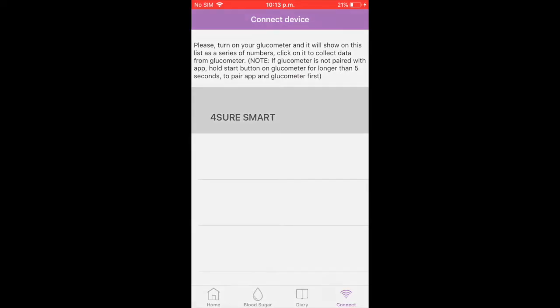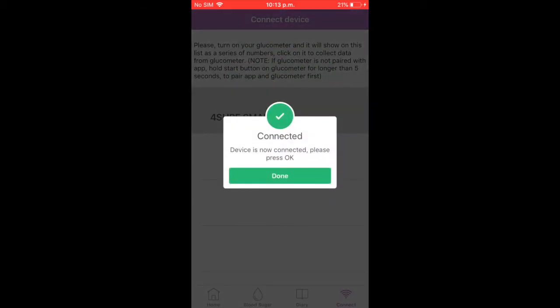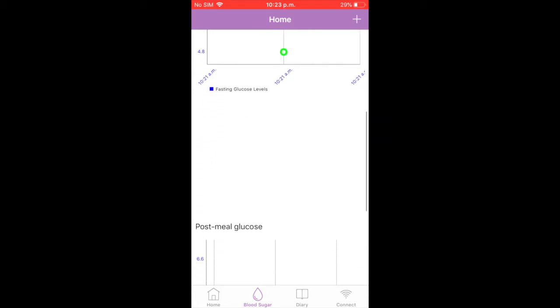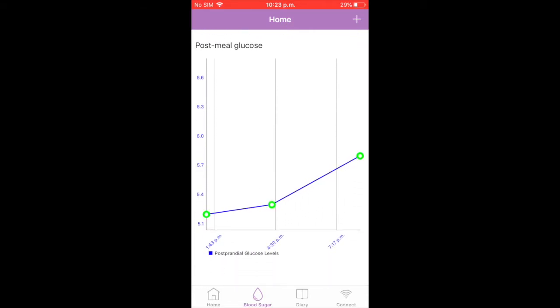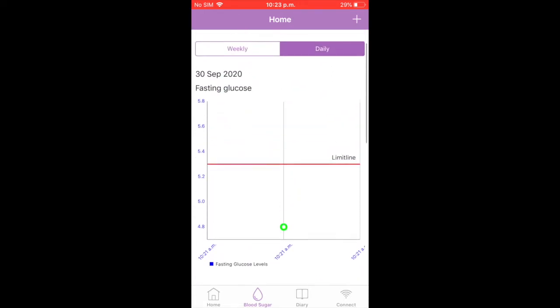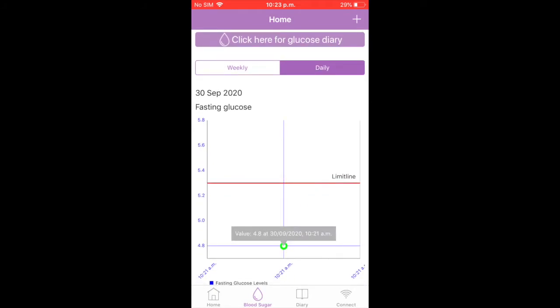Mary can now click on the ID to pair the 2 devices and transfer the readings from the glucometer to the app. These readings are then displayed to Rose on the blood sugar tab in an easy-to-use manner. GDMApp achieved this smoothly by using smart Bluetooth technology, the industry standard, as it uses less battery for both the mobile devices and the sensor, and is more secure because of the pairing of communication between the 2 devices.